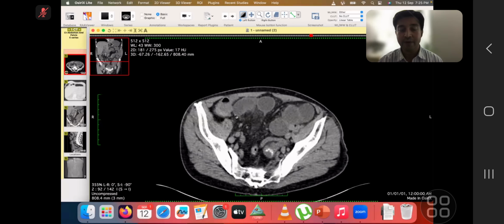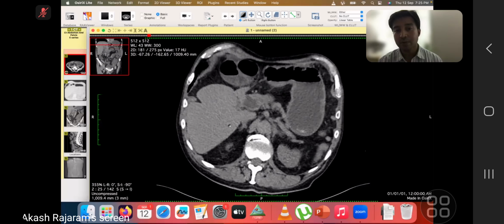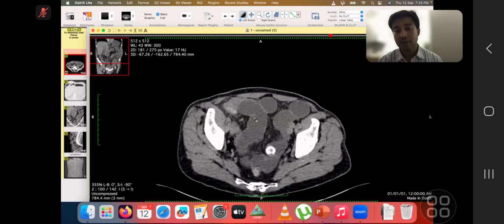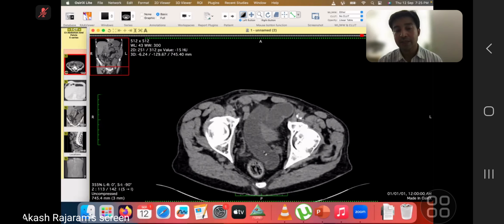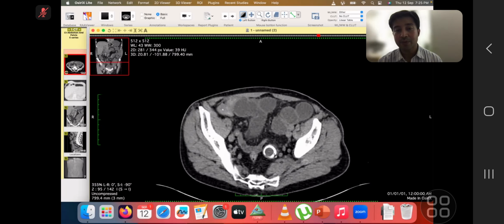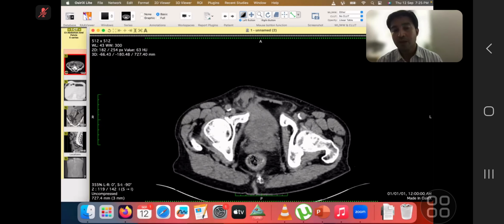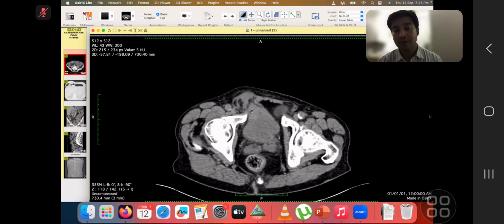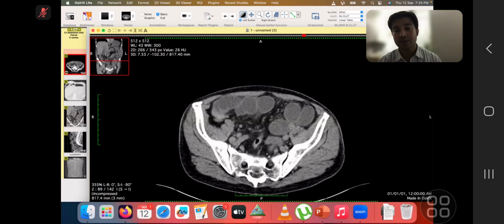This case is quite a straightforward case. So the patient has a prior history of gallstone, and you see the dilated small bowel loops, and the gallstone which is seen in the distal ileum, and the loops after which are collapsed. They just told you that there is an inguinal hernia, that is just to divert the case, but the inguinal hernia is not the one which is causing obstruction. It's the gallstone over here in the terminal ileum, in the distal ileum, which is causing the obstruction.